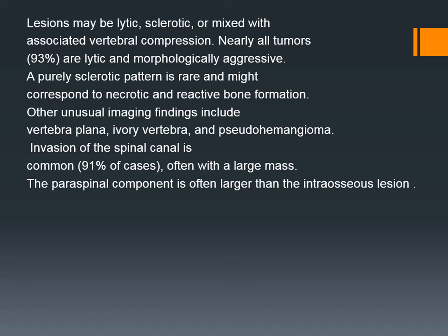Invasion of the spinal canal is common, 91% of the cases, often with a large mass. The paraspinal component is often larger than the intraosseous lesion.